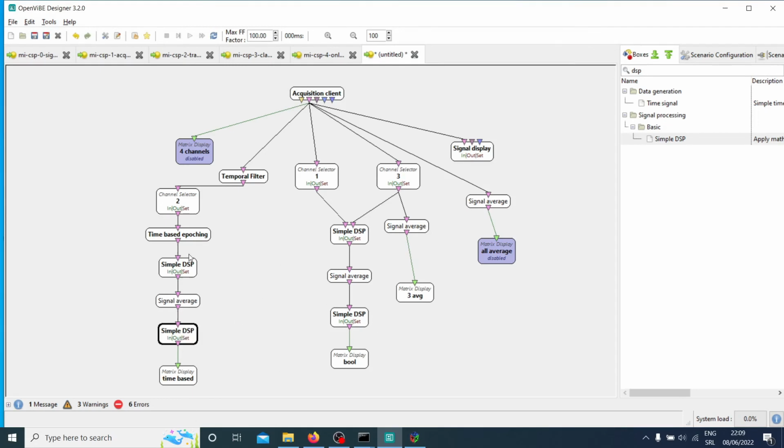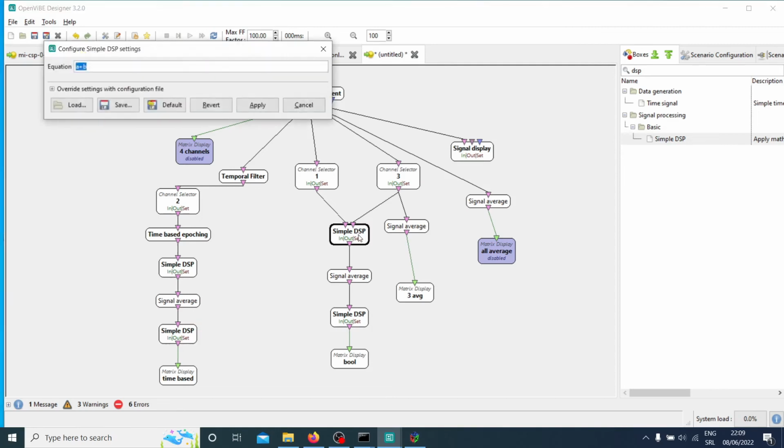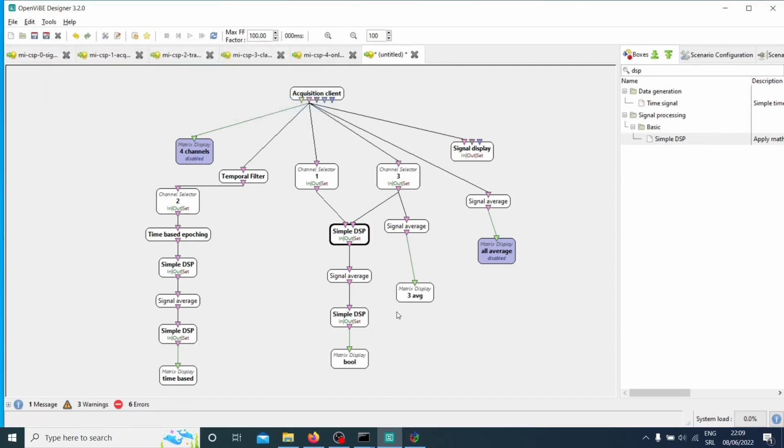You can learn a few things by playing with DSP and seeing how it looks and so on. What was it that I wanted to do here? I forgot. Sorry, my brain is just tired.